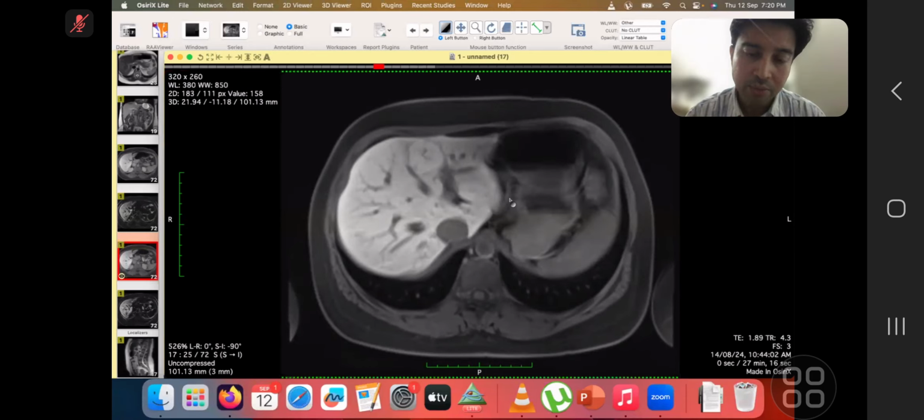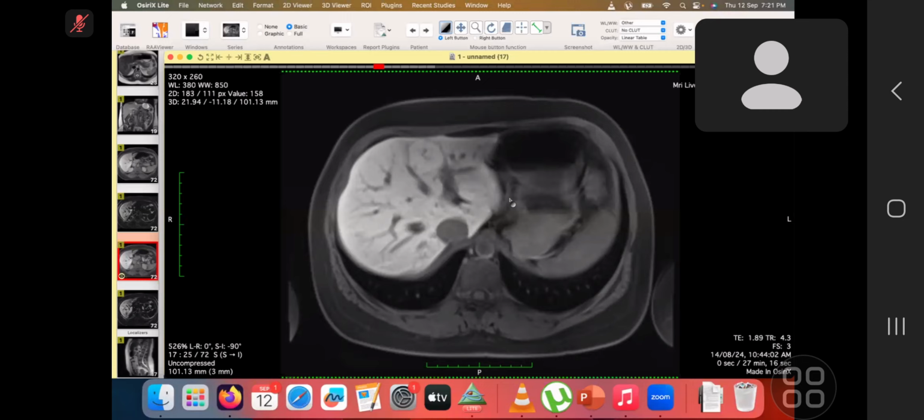What do you, I mean, I didn't understand that. Could you elaborate? What void are you talking about? No, there wasn't a void in the hepatobiliary phase. So a suspicious lesion like hepatocellular carcinoma will have a hepatobiliary void. It would appear hypointense. So at this moment, it doesn't have that void.